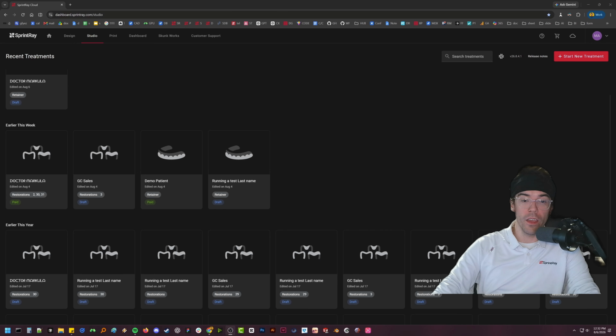It's been a while. We have a big new studio update to go through, including an overhaul of the retainer workflow, and a few buttons have changed places and some other things like that. So let's jump into it.